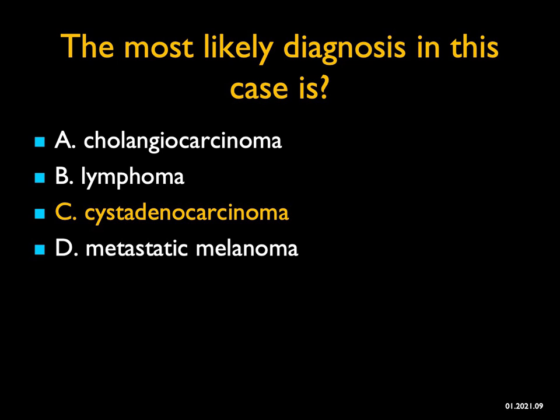Now remember, in the old days, biliary cystadenomas versus biliary cystadenocarcinomas, it's always a challenge to make the diagnosis. You'd be looking for mural nodules. These days, all of the lesions are considered malignant, so they all will be resected. This is a wonderful example of a cystadenocarcinoma.